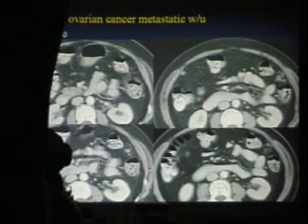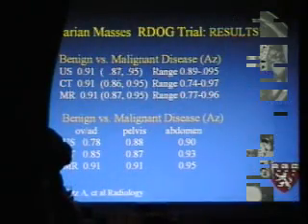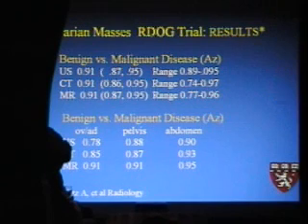You want to also look for the thickening of the peritoneal surfaces as a tip-off that there's disease. Two years later, it had grown a little bit more, not a lot, but certainly it had grown quite a bit and was up beyond the 2 centimeter mark. How well do the imaging modalities that we use compare to each other for this disease?